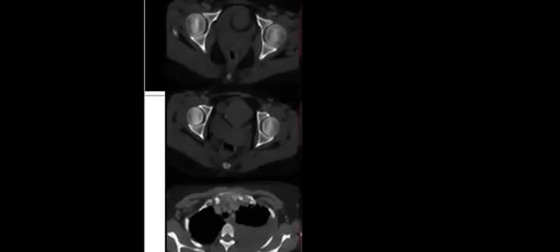But this is the importance of PET-CT in this case. Maybe there is, as you mentioned, a rib lesion, but here, so there is a right rib lesion. There is a hot spot in the anterior acetabulum. So anyway, it would be beneficial if this patient did PET-CT, as you see.